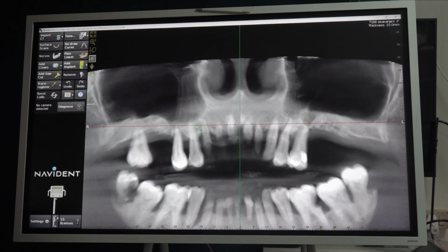So the more it is coming anterior, the more we are pushed towards the anterior region, and the inter-implant distance becomes more, and the need for pterygoid comes. Okay, so it is a classic situation where you place two pterygoids and anteriorly two implants. If needed, you can place two pterygoids. But now we are avoiding pterygoid, avoiding zygoma, placing as many implants as possible anteriorly, of course without violating the inter-implant safe distance.